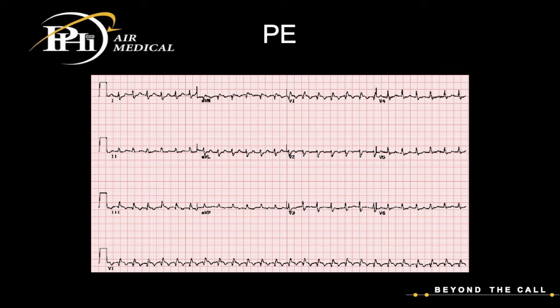So let's look at this 12 lead. I can hardly see P waves on this 12 lead at all, probably just because it's kind of a bad picture. But we'll call this a sinus tach at a rate of about 150. This heart rate is pretty fast, so we may actually not have P waves really visible on this.